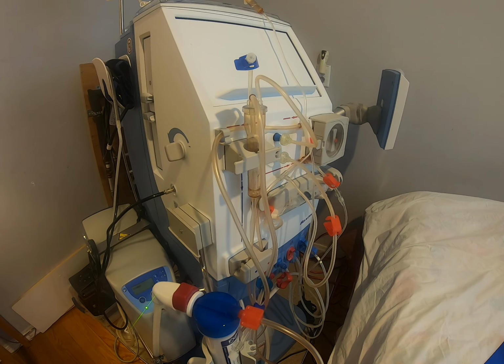So here we go. If you see at the bottom of this dialysis here, we have the red and the blue. These are the hoses that bring in dialysate. So the blue hose here will bring in the clean dialysate to the dialyzer. Let's trace the endpoint right here, because this is the original position now of our dialyzer. Red is up, blue is down.